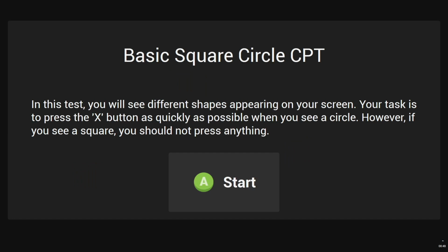Next is the CPT test. This is pretty famous. Bottom right, you see a timer. I will come to that. I just put a timer in here. So in the webinar, I don't sit here for more than an hour doing all those tests. So you can decide, should the test be timed, or is there an automatic end to it? I will say how long each test goes at the end of the webinar.